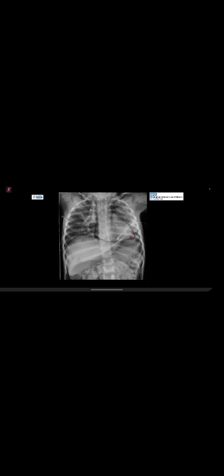Then I just have a couple of pneumomediastinum cases. You can see the continuous diaphragm sign and air along the aorta. Just briefly, this is a case who was on ventilation, had COVID pneumonia, and developed severe pneumomediastinum, pneumothoraces, as well as pneumoperitoneum. So that is just showing all the findings.